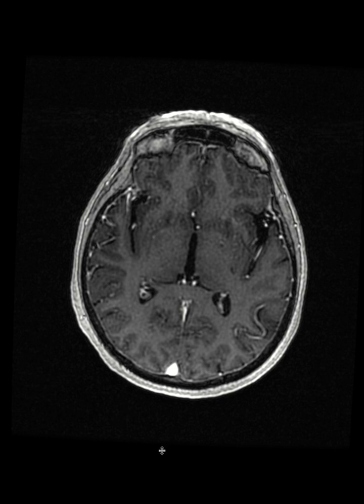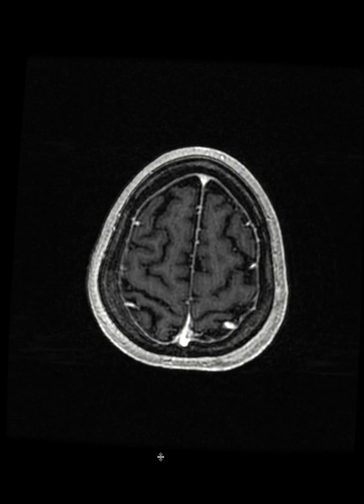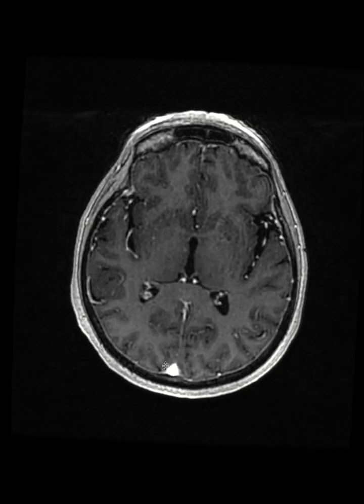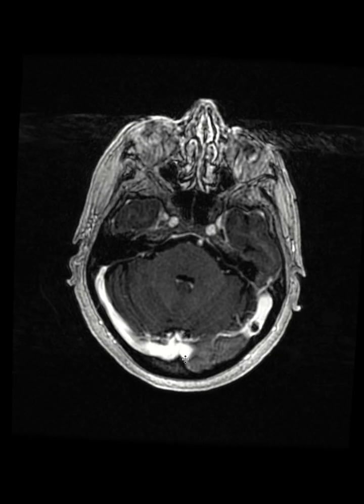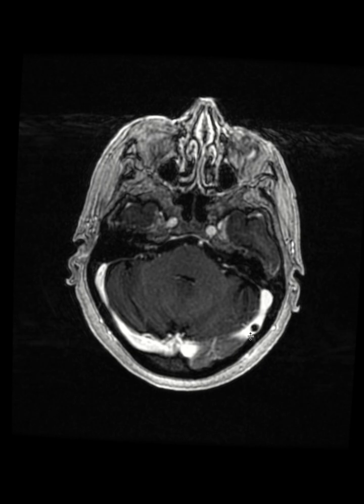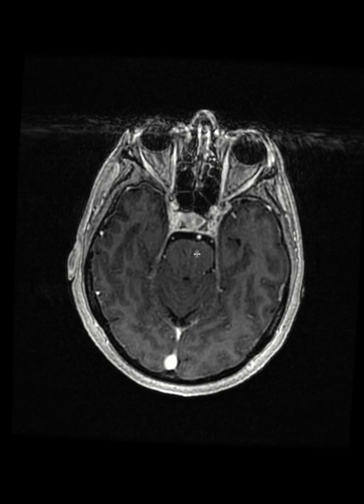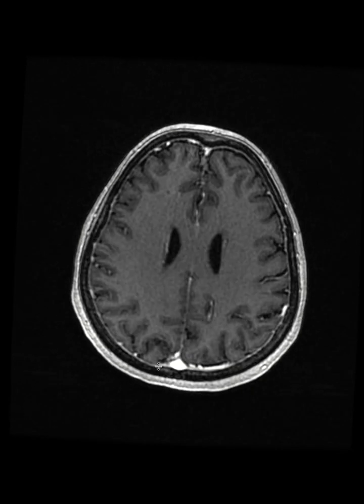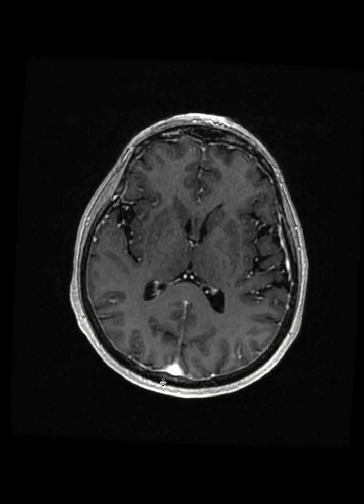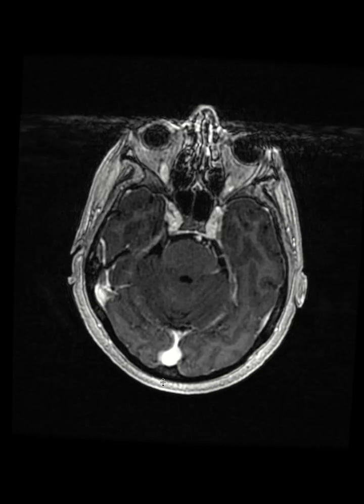Okay, and now we have this post-contrast. If you do the contrast or gadolinium administration, you're going to have this post-contrast sequence. In the post-contrast sequence, we're going to see the dural venous sinuses. As you see here, these are dural venous sinuses. In every single study with contrast, we make sure to look at these dural venous sinuses. These have nice arachnoid granulations, and then you have the availability to look at all the skull-base vessels or intracranial vasculature, and then look at the brain parenchyma, calvarium, or soft tissues for abnormal enhancement. So basically this is a post-contrast sequence, as you guys see.